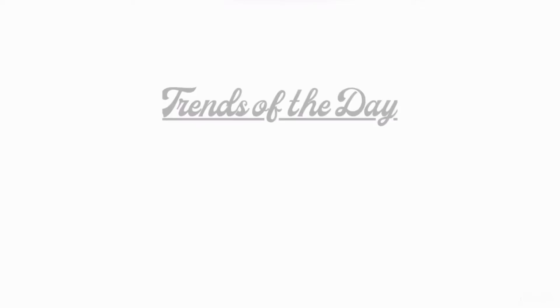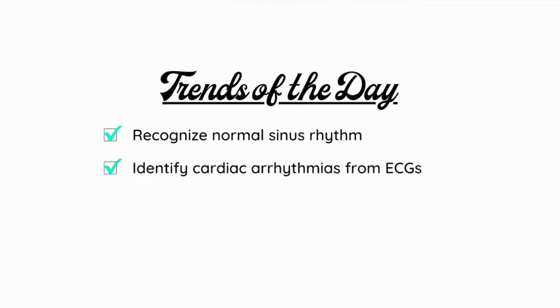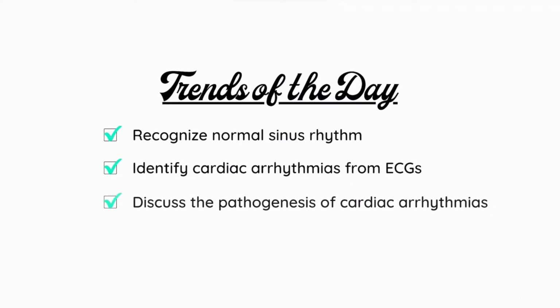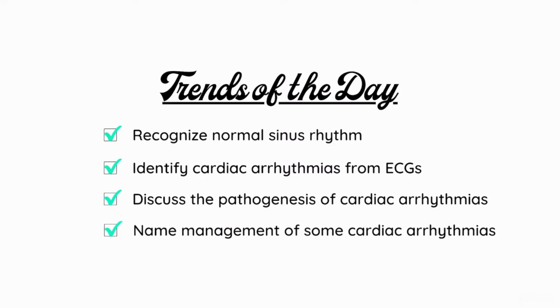Today, we'll be talking about the electrocardiograms, or ECGs, of cardiac arrhythmias. By the end of this video, you'll be able to recognize normal sinus rhythm, identify cardiac arrhythmias from ECGs, discuss the pathogenesis of cardiac arrhythmias, and name the management for some cardiac arrhythmias.